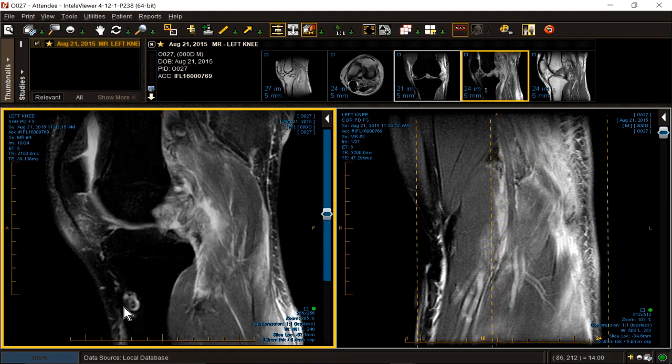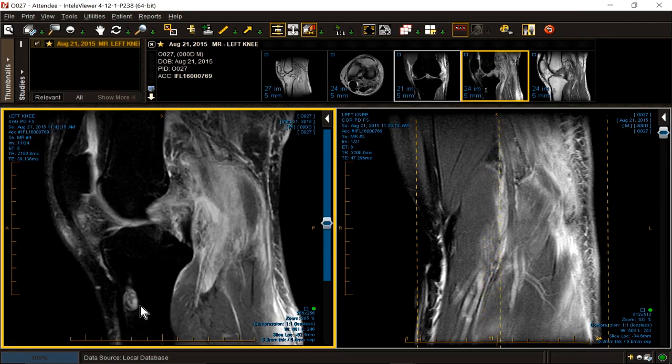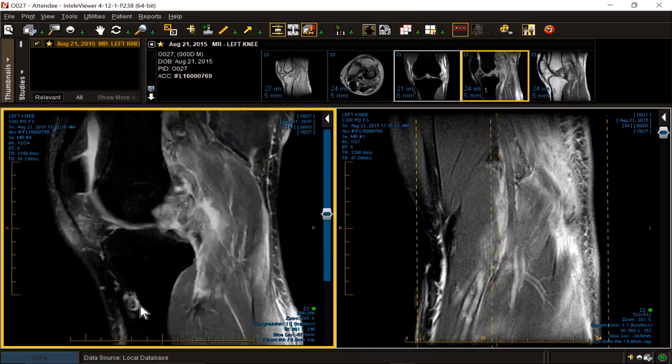Yes, I will give you the fibrous inclusion defect or non-ossifying fibroma down low, so what? That goes in the body of the report. I will start my conclusion with kissing bone lesions anterior, consistent with hyperextension, dislocation mechanism of injury with the following ligaments disrupted, and then I'll go medial, 1, 2, 3, 4, 5, or A, B, C, D, E, and then lateral, A, B, C, D, E. And then at the bottom I'll put menisci spared.